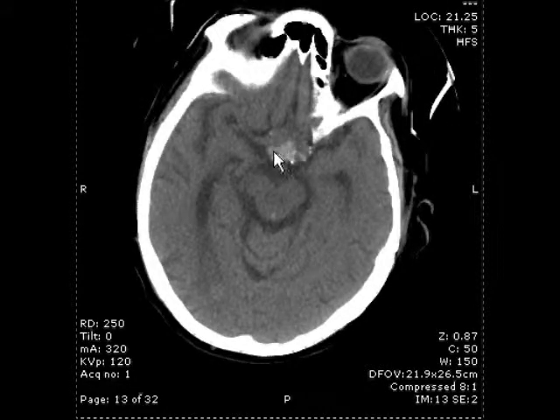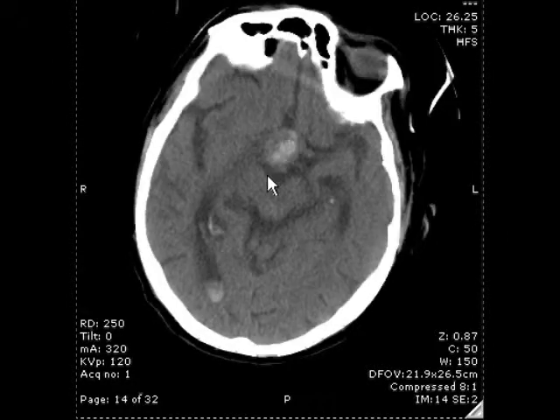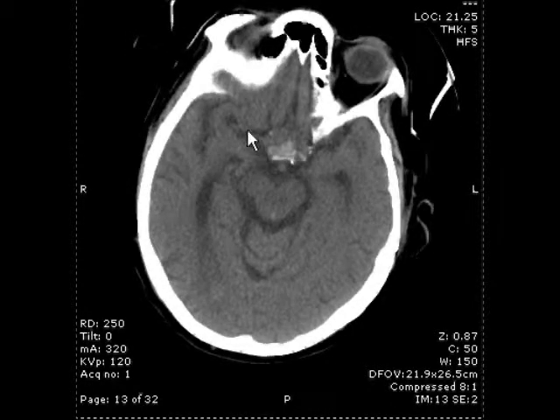We've got the suprasellar cistern, and then I like to think of a six-pointed star with each star representing a portion of the basilar cistern. So think of a triangle here. The points here and here are the ambient cisterns, and then the anterior portion of that triangle here is the interhemispheric fissure. And then we've got an upside down triangle in this area with these points representing the sylvian fissures and this point representing the interpeduncular cisterns between the two cerebral peduncles.